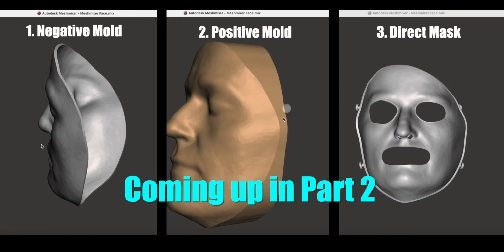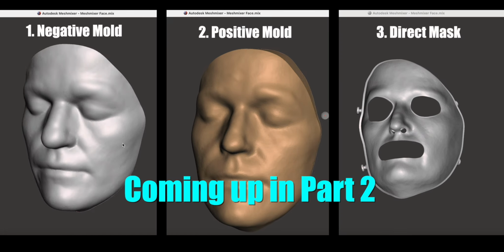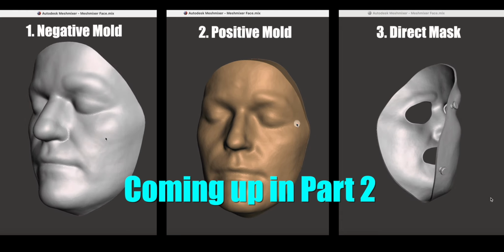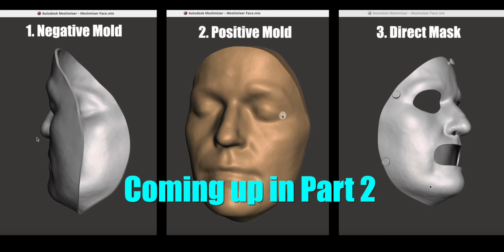At this stage, the prep work is done. Stay tuned for part 2 where I'll show how to convert this mesh into either a negative or positive mold for pulling an orthosis, and also how you can create a directly printable mask.